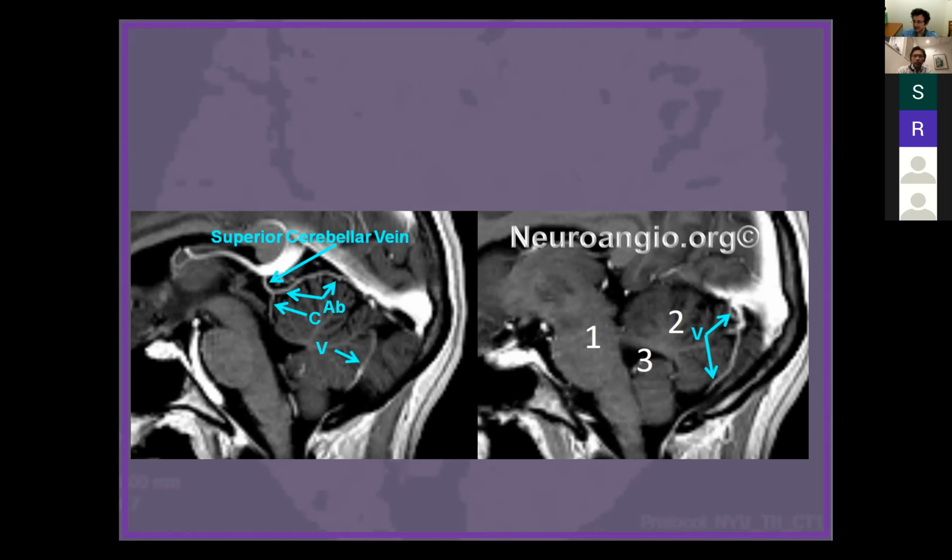If you're learning about veins, I think the best way to learn them, if you're doing angiographies, is you put up an angio on one side, you put whatever your cross-sectional thing is on the other side, and you just look. You look for same structures, you look for locations. That's the way to learn, and you understand the relationships. Of course, veins hug the surface of the brain much more than the arteries do. So in terms of understanding what the brain structures are relative to the veins, that works better than the arteries most of the time. And it's important to study that.